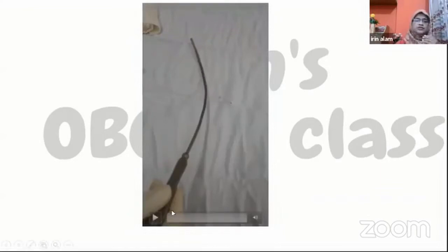This is uterine sound. Here, there is an olive-like end. This is blunt. And the uterine sound acts as a first dilator.